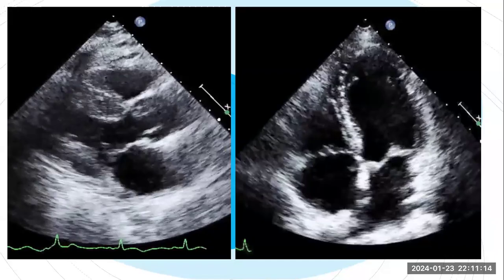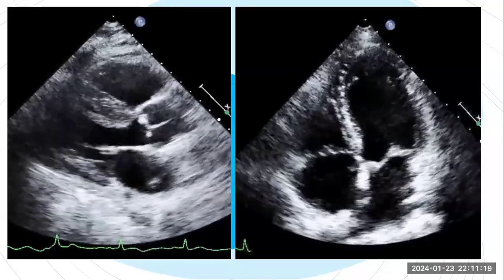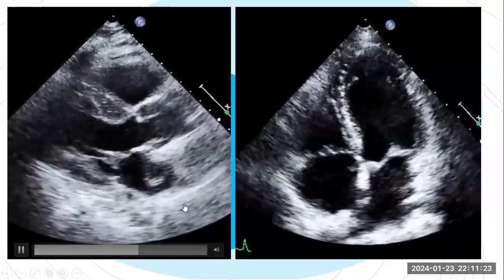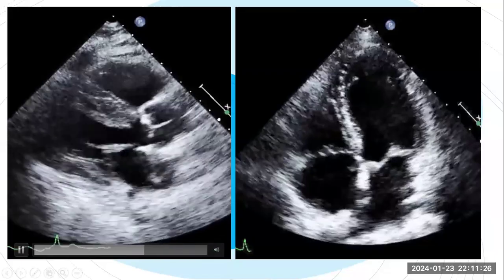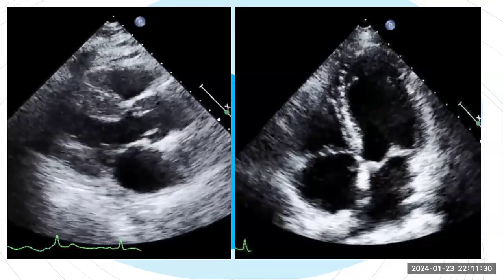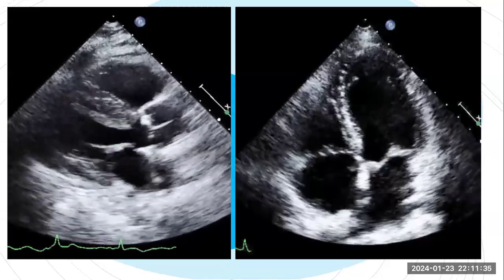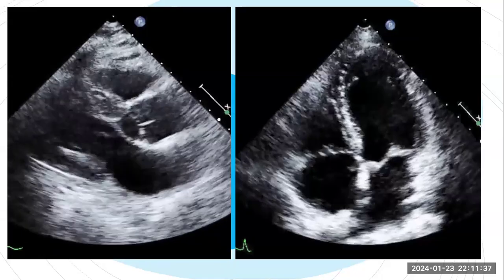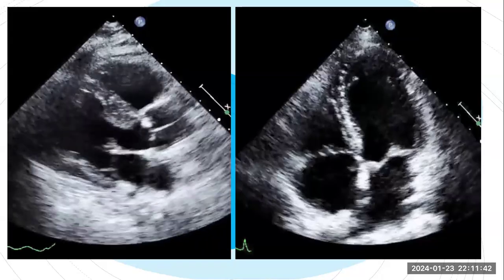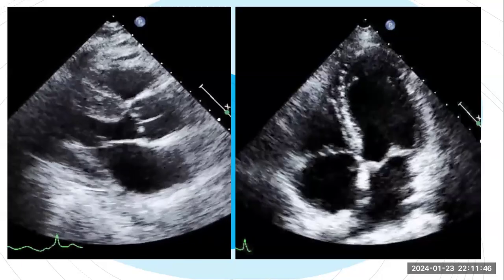This is just some calcification in the aortic valve. But the tricky point here is that it's fine to start to comment that I can't see a shadow coming. It could be a cyst. You can give a differential here, and you can say that there is what looks like a mass inside the LA, and after that you start to comment about the possibilities and what further views you want to see, confirming or excluding your differential.